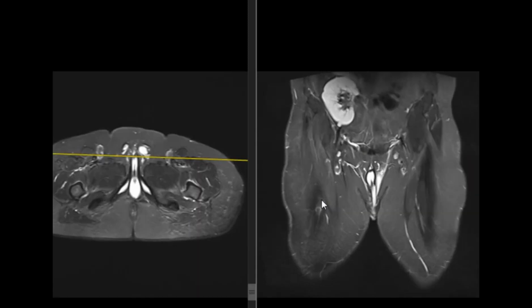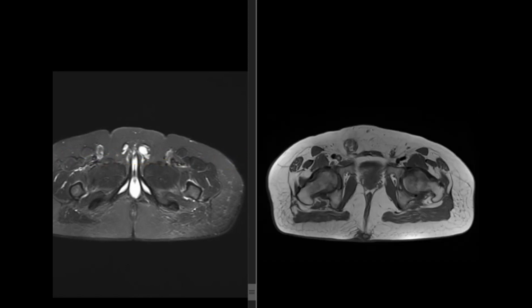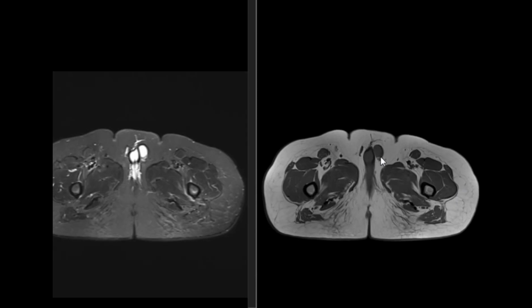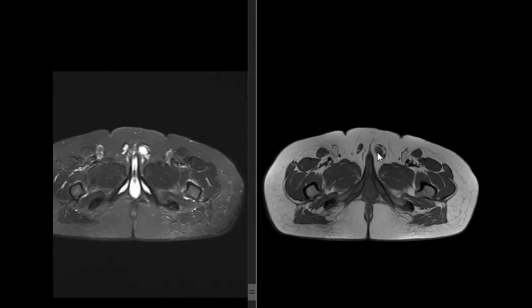What do you think this is? You should try to see the scrotal sac. Let's see on the T1. This is the lesion. It's iso and hyper, and it's located here, and this is the other, what? Testicle. So he has, in addition to all of that, what? Bilateral undescended testicles in a 25-year-old male, making him at high risk of seminoma, of germ cell tumor.